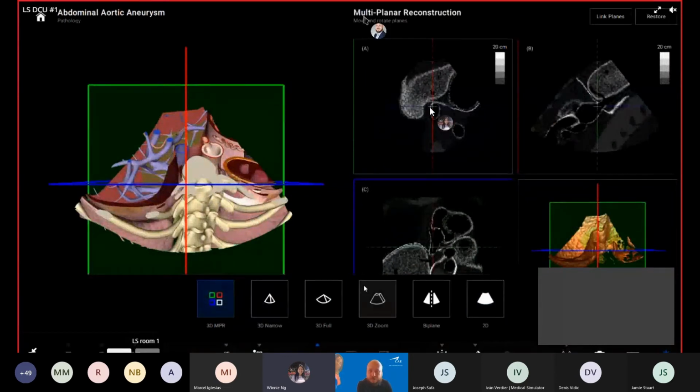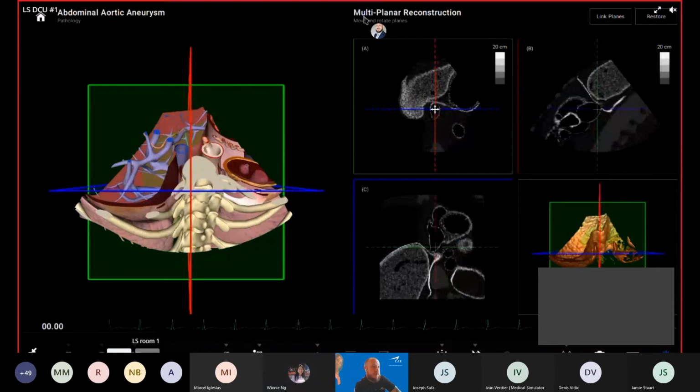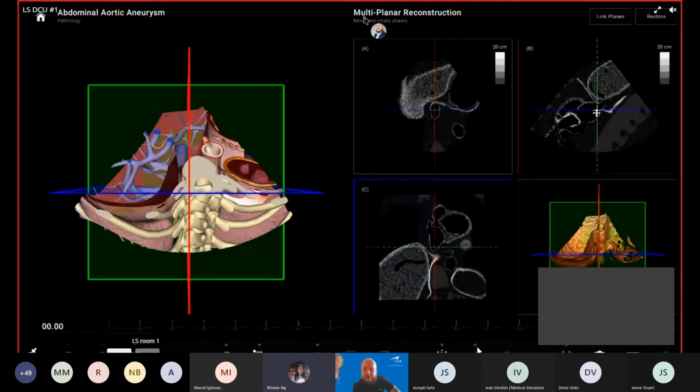So what we could do is go over here and tell Eric that we could measure the aneurysm, all these kinds of things together. So let's say we are trying to discuss together that Eric, would you mind to, yeah, there you go. It's a little bit slow over here. It's just slowing you down a bit.